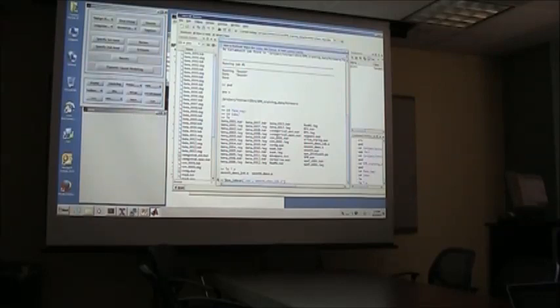So there's this function SPM jobman, which basically allows you to run anything from a command line. And this is where you can make your whole analysis setup a lot more efficient by not having to click on everything, but making a template for one person, replacing the subject-specific fields with another subject name, saving it, and running it within the command line.